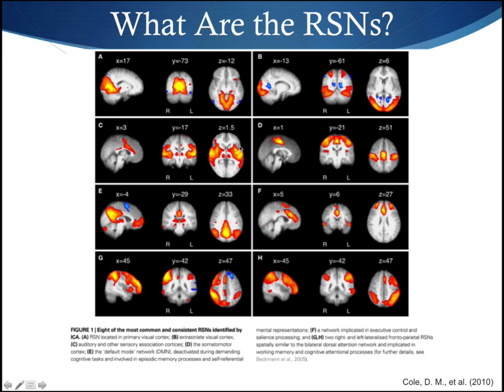The network I draw specific attention to is in E. This is the default mode network. What we typically see is activation in the posterior cingulate cortex and precuneus, the inferior parietal lobules, the mesial frontal lobes, and more subtle activity can be seen in the hippocampi and in the cerebellum. These tend to be the more commonly appreciated areas on functional MRI as opposed to PET imaging.